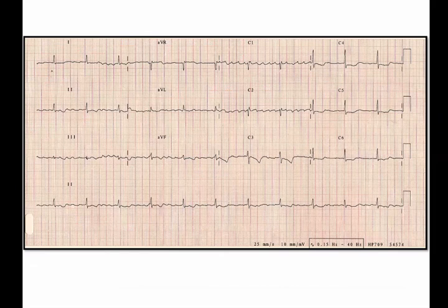What do you see here? So I have not put polling questions here, but what you see here is that in lead V1 there are P waves which look well formed, but if you look at other leads, the P waves are not very well formed and they are not of the same morphology. And the atrial rate is also varying. So this is what we call coarse atrial fibrillation, with irregular PP intervals.